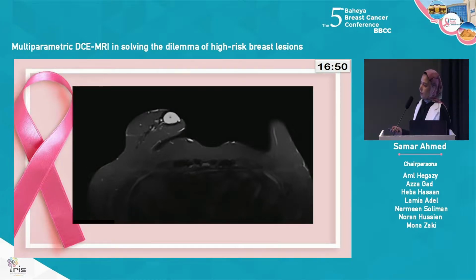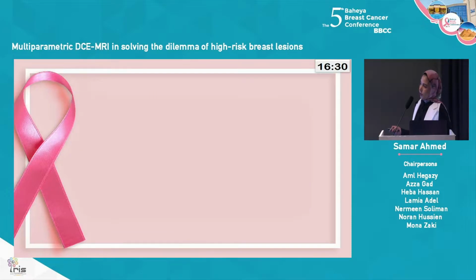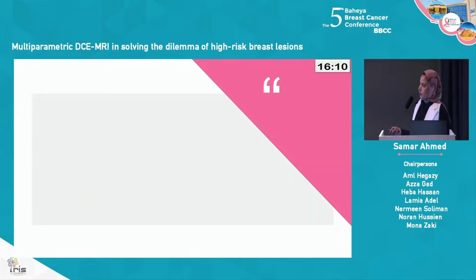Example of our cases: a 45-year-old patient with strong family history, showing multiple bilateral complex cystic lesions on sonomammographic assessment. Dynamic contrast enhanced MRI revealed bilateral cystic lesions with intralesional soft tissue component. The intralesional soft tissue component elicited mass enhancement showing type 2 curve and ADC value of 1.23. Ultrasound-guided VAB excision revealed intraductal papilloma, UDH, and ADH. Surgical excision revealed low-grade ductal carcinoma in situ.